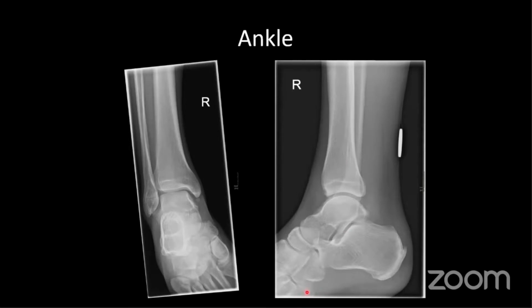I presume some of you are radiographers, because someone said this is always needed on a lateral ankle. Yeah, no, I agree. This is the standard view. This should be obvious, but sometimes there are suboptimal views, and they'll be right at the edge of the film, and this is where you miss stuff. There isn't a fracture here. Actually, I'm just illustrating the point.